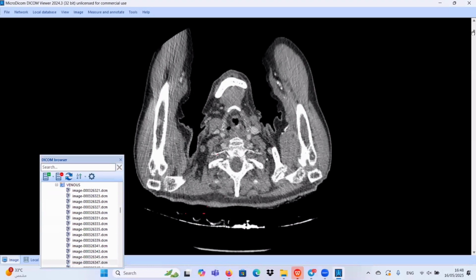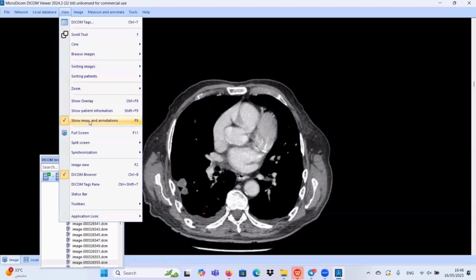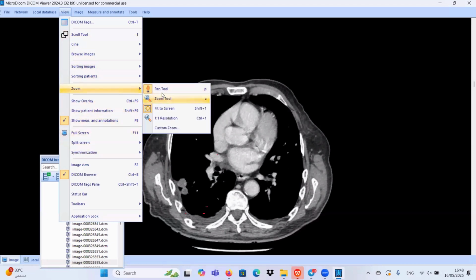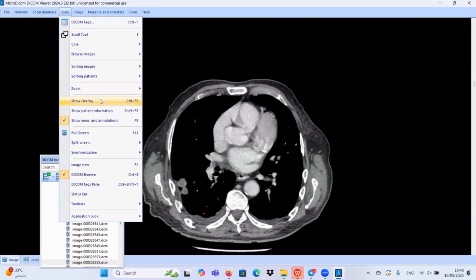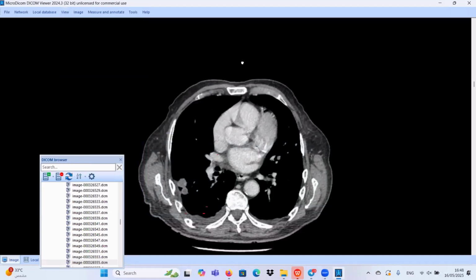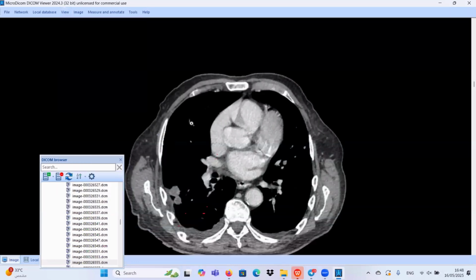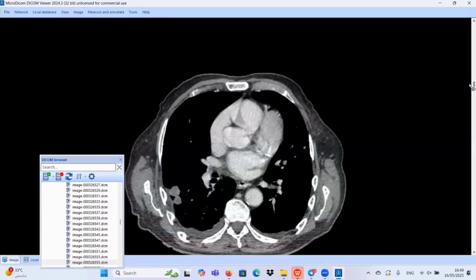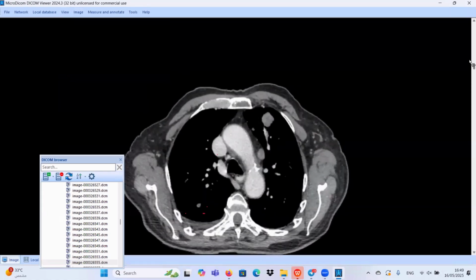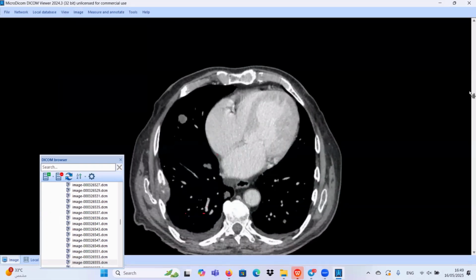Okay. Sir, I'm looking at the CT scan images. I could appreciate multiple lung nodules and mild bilateral pleural effusions. Just a minute, I am sorry. Okay. Yeah, sir, we have multiple pulmonary nodules. Okay, I could say multiple pulmonary nodules.